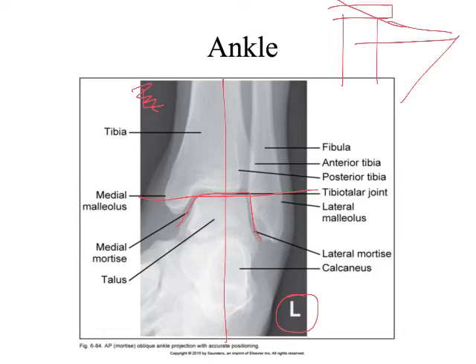I know there's a lot of x-ray techs, or maybe hopefully not a lot. There's a few bad apples out there, right, who like to center wherever and then crop appropriately. That's not doing anything in terms of image analysis. You can look at the picture and very quickly see they were not centered on the joint, they were centered on the knee and then they just cropped it.